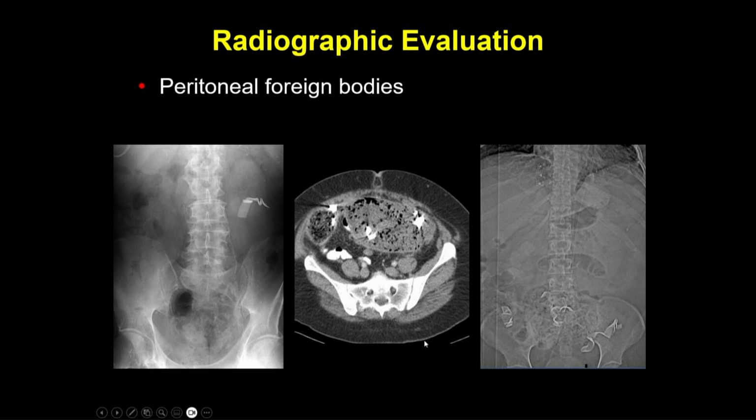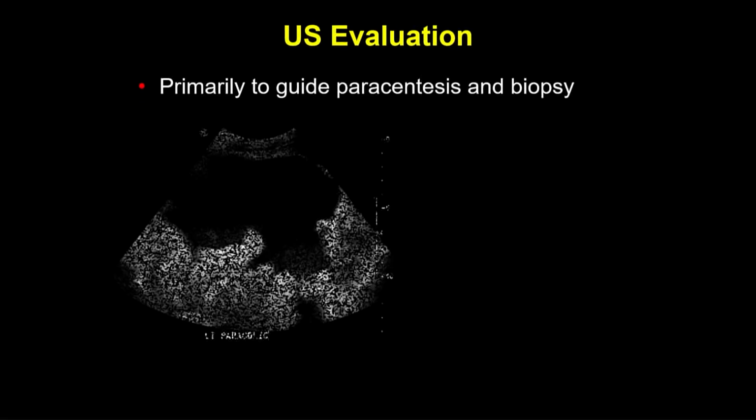So really, I think glancing at the scout should be in our search pattern. Just in general, we have a whole paper on how the scout can help find things. It's better at bowel gas pattern, of course, than the CT is. It puts it all together in one quick look. So I would recommend that we still keep that in our search pattern. I try to. Unfortunately, our new hanging protocols don't include the scout anymore, so I have to manually pull it down every time.